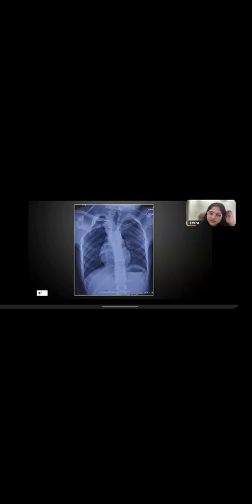Now, case number 37. I only have 38 cases, so this is the second last case. This is not a focal bone lesion, but the diagnosis has to be mentioned by you. Yeah. So Sprengel's deformity, there are multiple vertebral anomalies. One, the right scapula is deformed. And so this is one example of Klippel-Feil or Sprengel's abnormality. There are multiple vertebral abnormalities. There is dorsal scoliosis towards the right side. All these things you will have to write and explain if this comes in your RAPIDS. Okay. Last case of the evening.